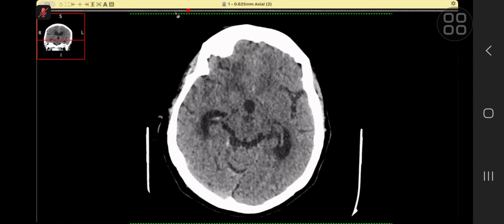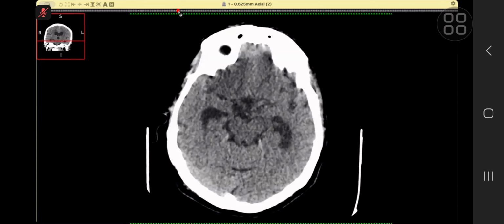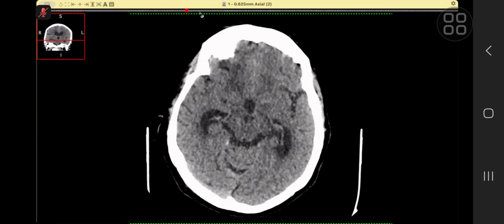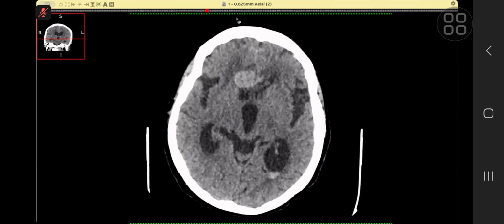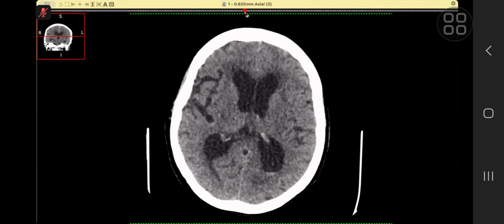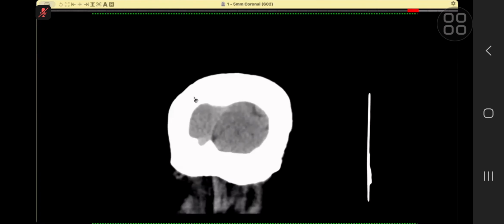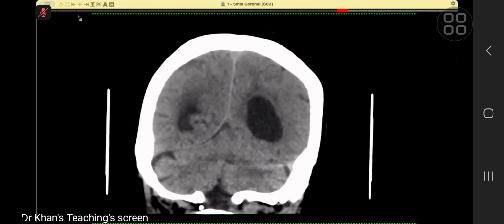So you mean to say this is an intraparenchymal hemorrhage with intraventricular hemorrhage? Yes, sir. So where is it located? Where is it located, the hemorrhage, intraparenchymal? Sir, I would like to just see these images in the coronal plane. Coronal plane. Okay, yes, just 1 second. Over to you. It's not moving actually. Yeah.